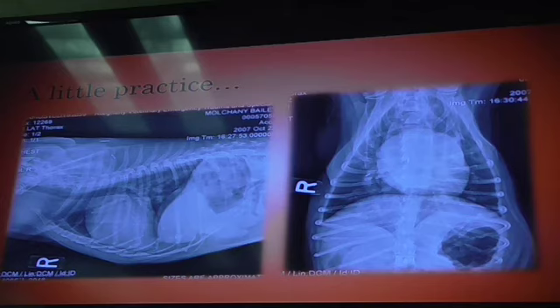Okay? If the veins, which are coming into the left side, are enlarged, I expect some disease going on the left side of the heart. Correct? All right. So you guys see how it's important? Again, we have to know our anatomy, and I made us go through the blood flow.